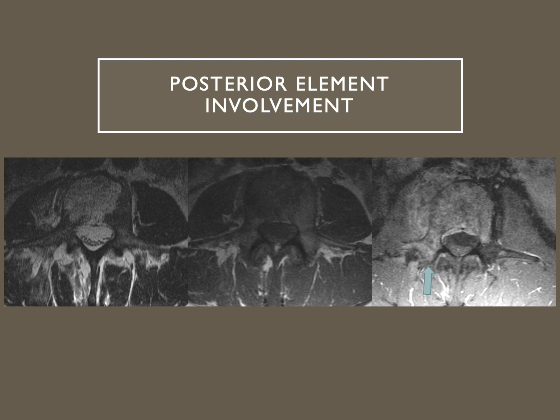So posterior element involvement can happen in both conditions, but in osteoporotic fractures it will tend to be more edema rather than soft tissue, whereas in malignant lesions you will see soft tissue involvement.